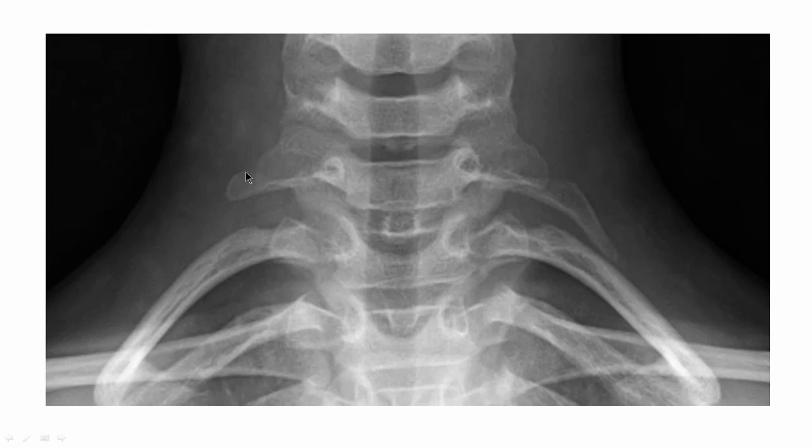So what is this? What's that thing? That's actually a rudimentary rib. I guess you could call it rib 0 if this is T1, T2, or rib 7, but it's a rudimentary rib budding off the C7 transverse process. So this side is at high risk for thoracic outlet syndrome. Thoracic outlet syndrome is sometimes hard to tell apart from a radiculopathy or radicular pain, or pain down the arm, in other words. So we'll talk about that.